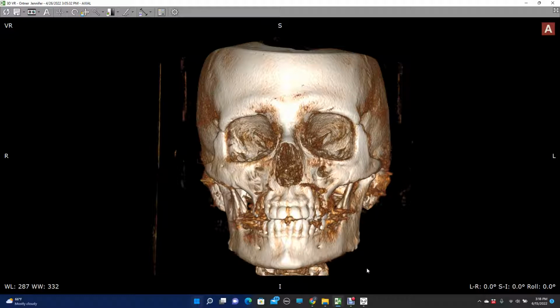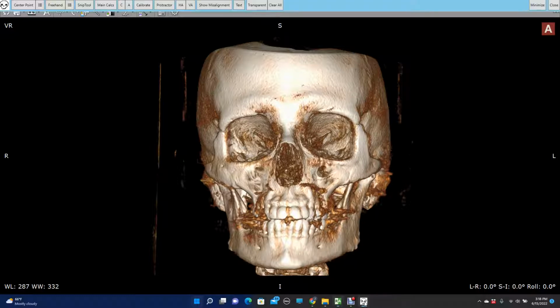And so the upper cervical toolkit you can see here in the bar. If I open it up, it is a digital overlay tool with all of the most commonly used tools for the practicing upper cervical doctor. If you haven't seen my other videos on Toolkit, please check it out.